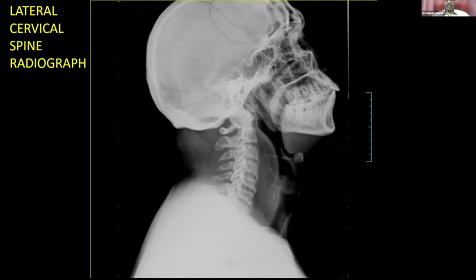Similarly, you can look at the epiglottitis, any infections there. So whatever maximum things possible you can see. Similarly, when you are suspecting trauma-related things, then you have to see whether the vertebral alignment is correct. Is there any fracture? So all those features you will be looking for. So these are the common things which will produce prevertebral soft tissue widening.